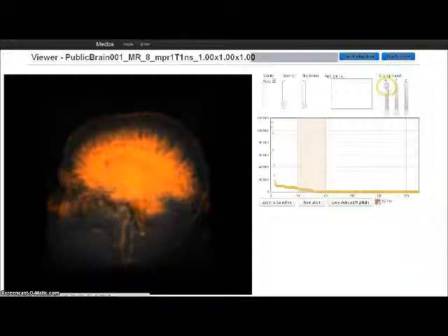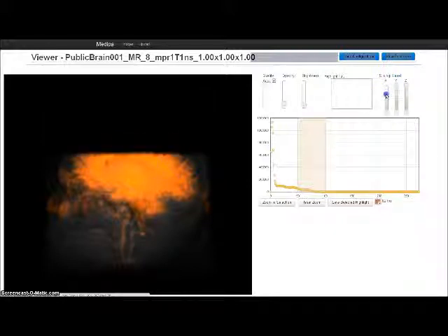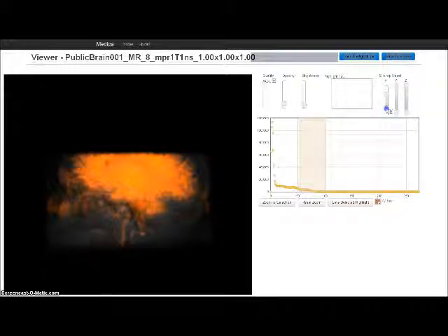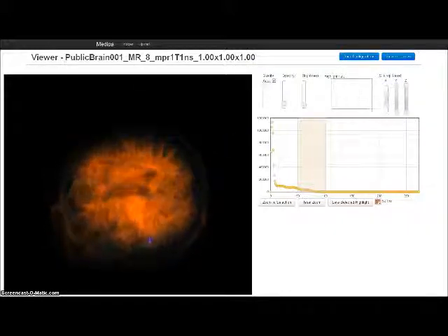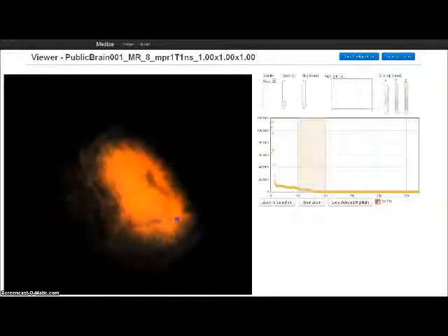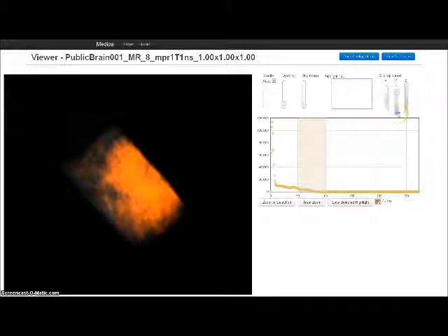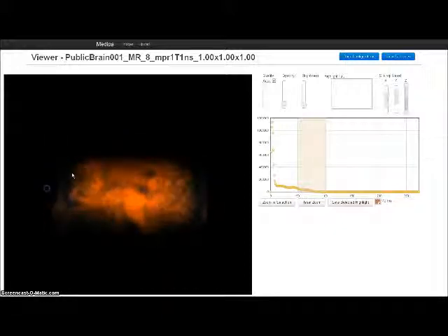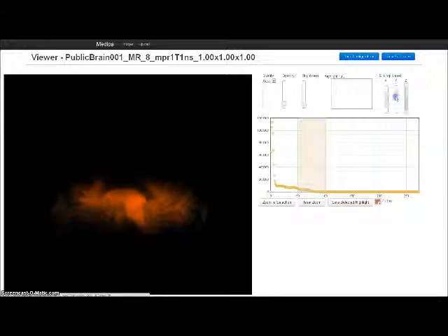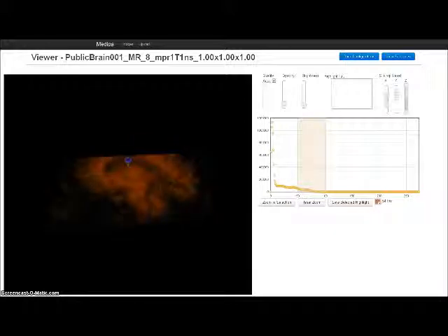As you can see from the model, if I tweak the control just a little bit on this axis, the top of the brain starts to slice off. This is basically the functionality of slicing. We allow the user to be able to cut off certain pieces of the model and thus allowing them to examine the parts that they want to examine without all the clutter. As you can see from this angle, we basically can cut the brain off into a tiny little cube. This way, if we really wanted to, we can simply examine this slice and highlight and annotate however we want.